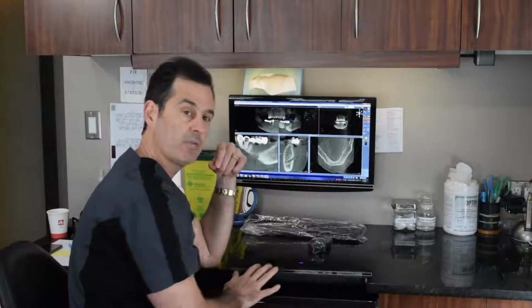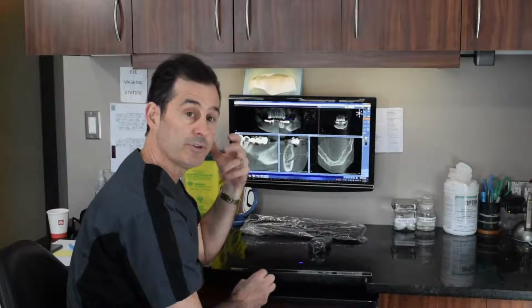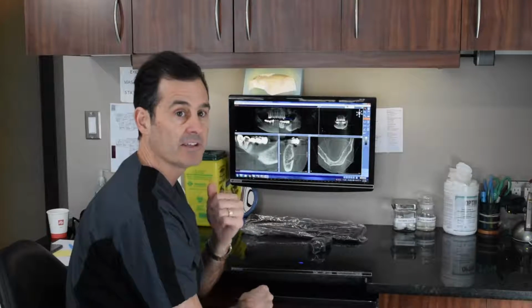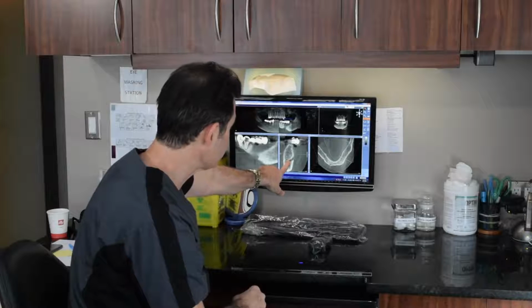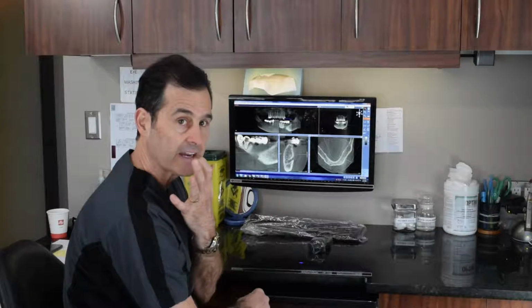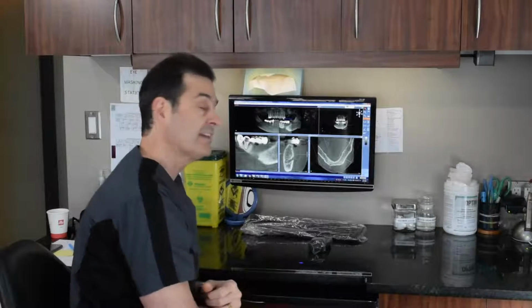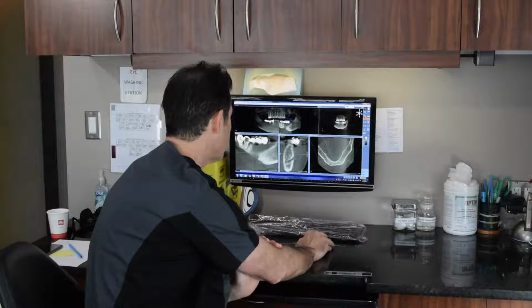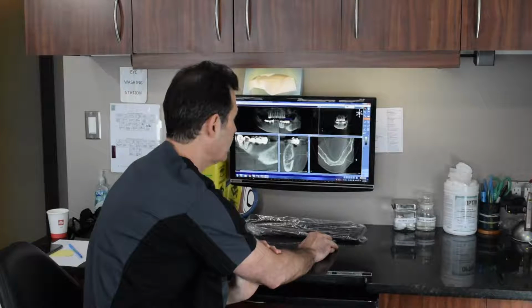This is the nerve that when we're doing dentistry on the lower teeth, that's the one that we numb up. And if we were to damage this nerve in surgery, you would be left with a permanent numbing of that lower lip. So obviously that is a very bad thing that we don't want to do. So what we're going to do is mark out where the nerve is before I start planning out all my implants.